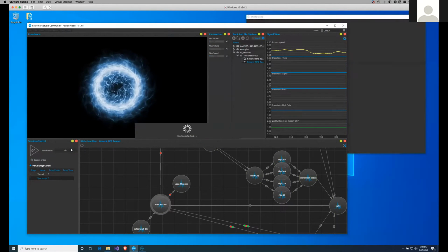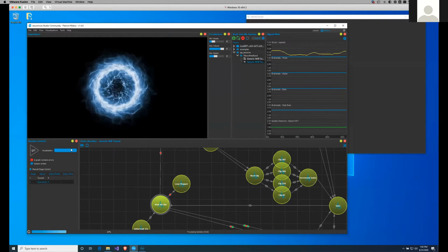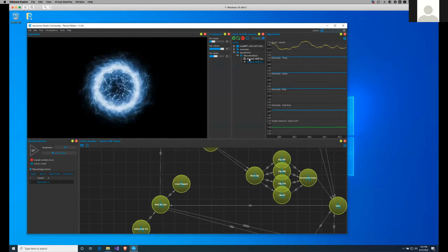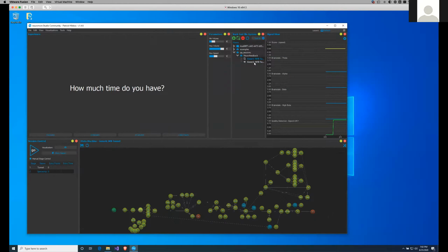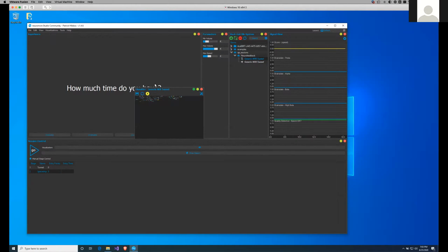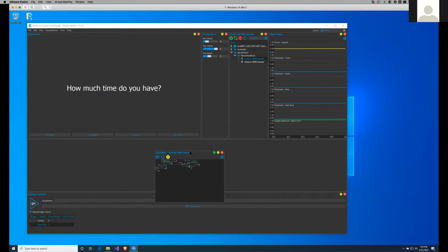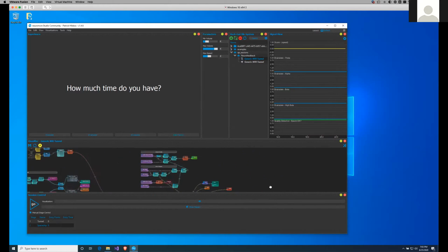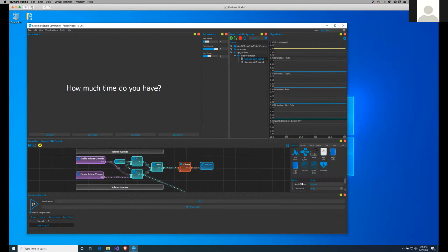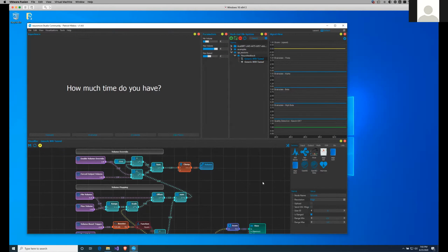All right, there's a question for Marco. He's asking, you have implemented a new way of using videos and audios for the feedback, how to use them? It's pretty simple if we do not use the visualizations. If you use audio, the overall volume of the studio is controlled, and the whole feedback control happens through the classifier. So let's get it back up. Classifier. The result of the feedback node volume will control the volume of the audio of the studio.